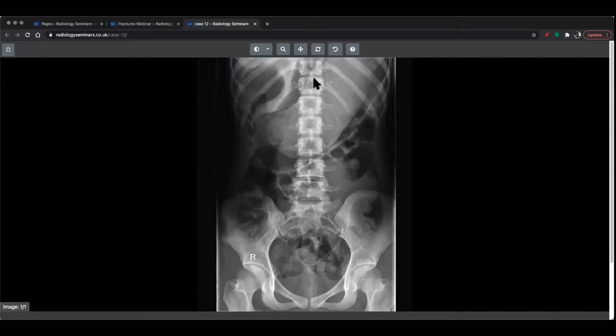Yes, this is the shape of the stomach, but normally it's full of air. It's not going to look like that. So even if you went back to basics, you know there's something up. You're going to end up getting the right study for the patient in the long term.